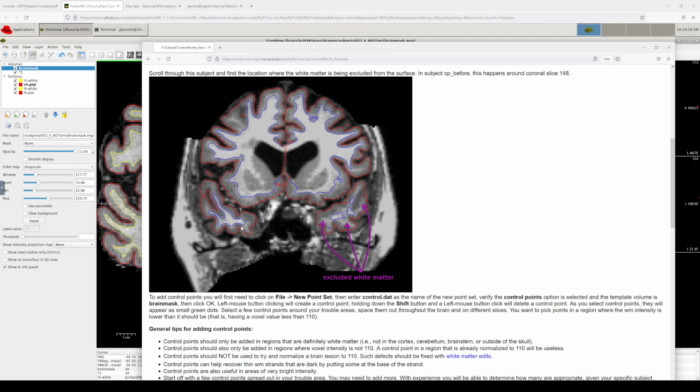issue, and it's this transition between gray matter and white matter, so there's a little bit of uncertainty there. But here there's some pretty clear, like here's a whole gyrus, and here's a whole gyrus that should be picked up. This side is getting picked up okay, but this side is not. And so this is another one where you can follow these instructions.